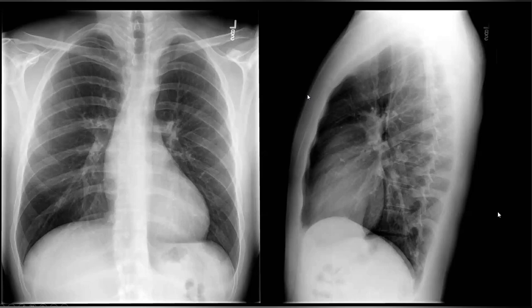Then we will look for any valvular disease or septal disease. If you say that you do not see a well-defined aortic arch, I would repeat my question: what do you think you should see on the frontal radiograph? What do you think are these lines?